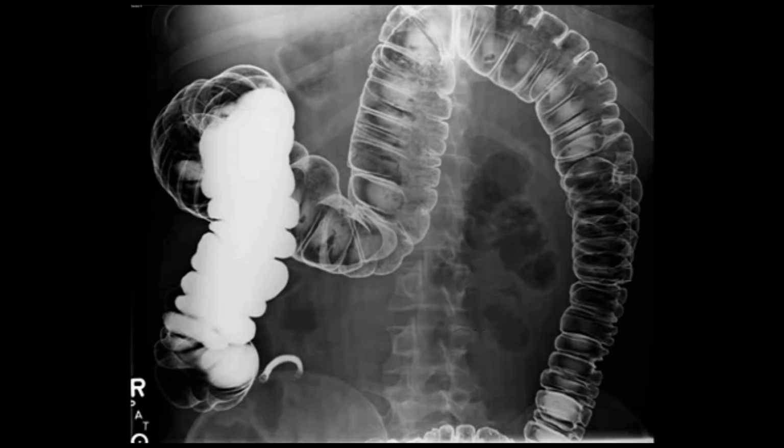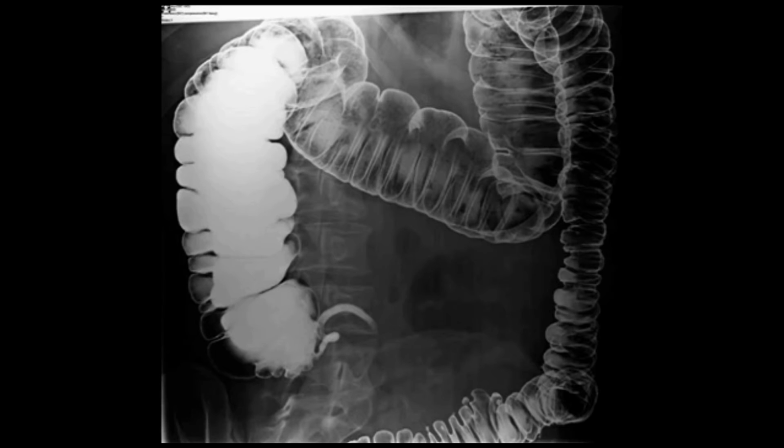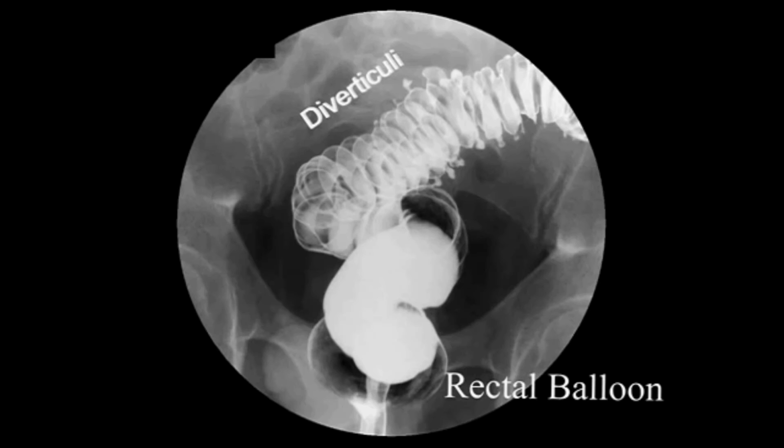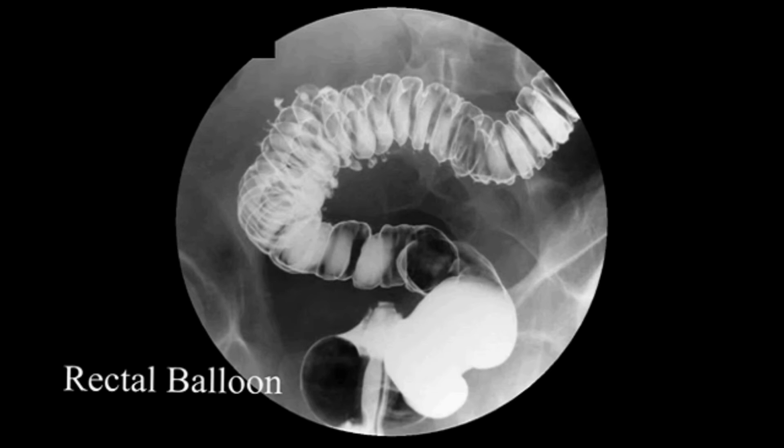Again, in this image, the appendix can be seen and an almost three-dimensional view of the hepatic flexure becomes obvious. As we move forward in this oblique view, the hepatic flexure of the colon becomes even more prominent. Hopefully by now you realize the form and figure and length of the colon is hardly how it looks in your medical textbooks. Here the rectum can be seen diving somewhat posterior, and the sigmoid takes a sharp curve. Performing a colonoscopy on some of these patients is challenging.